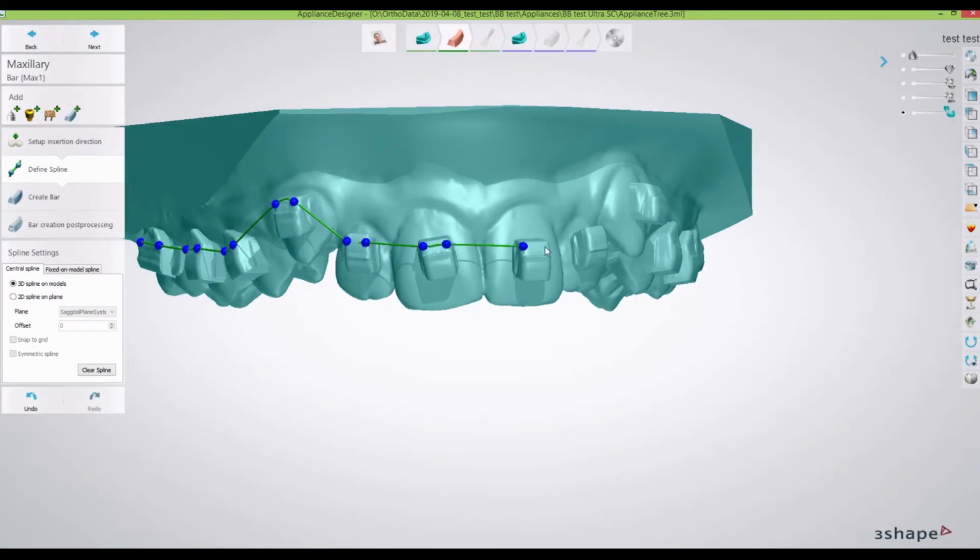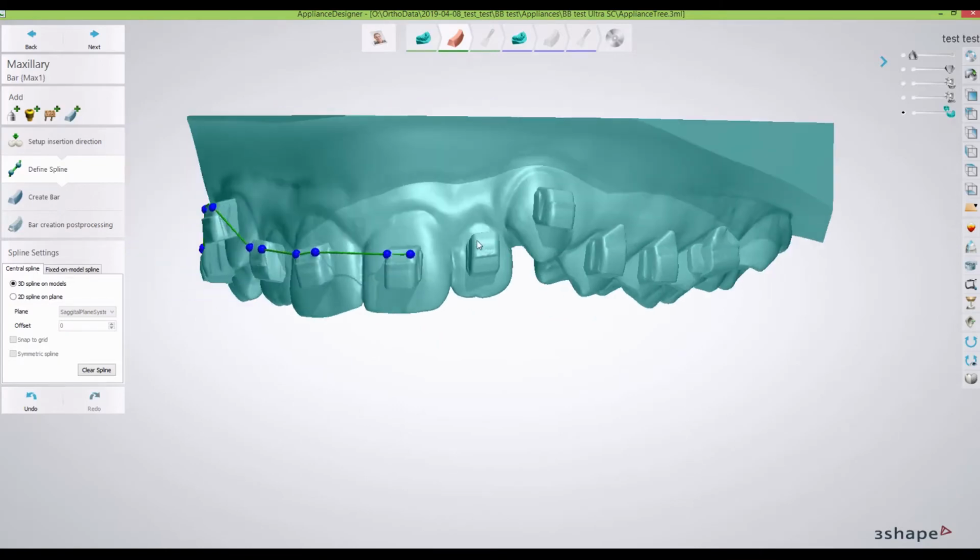So you're going to connect all of the dots. Now, say if I had a tooth I wasn't bonding, or a tooth that wasn't present, a more deciduous tooth, go straight to the next one. Don't touch that tooth, because wherever you touch it, it's going to dip it in. And for the bulk of this tray, we want there to be a thickness interproximal.